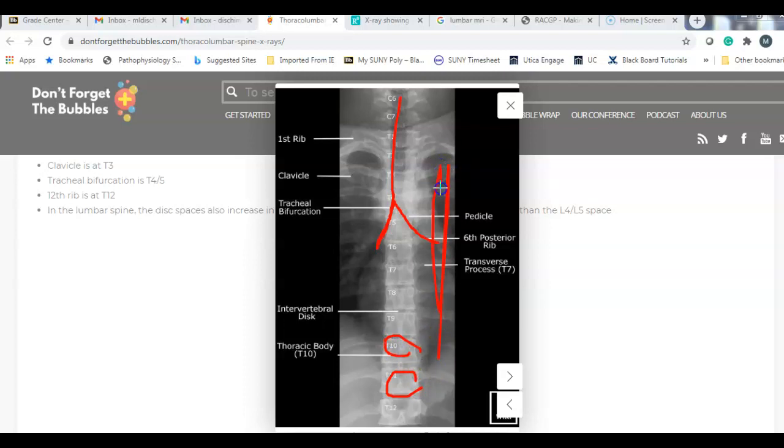You know, there's a little bit of soft tissue. I always want to look, even though we can't see all the way out into the lungs. But that's a nice breakdown there. You can even see the transverse processes, which are the little arms that stick out to the sides. Okay. And then there's pedicles. And, you know, once again, I'm not getting into all the specifics, but there are certain areas that are more prone to fracture. You can fracture those pedicles. That's why I think they have those marked.